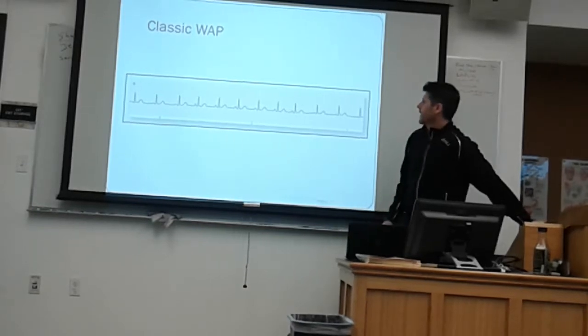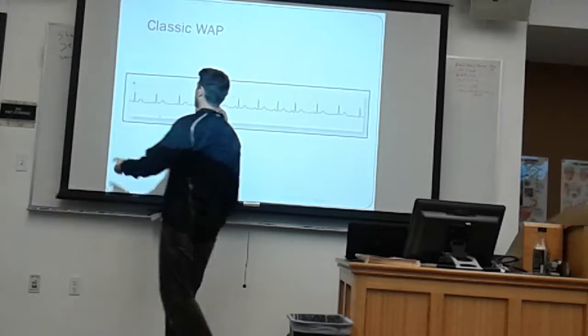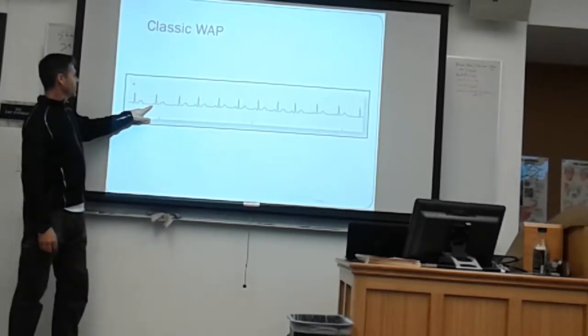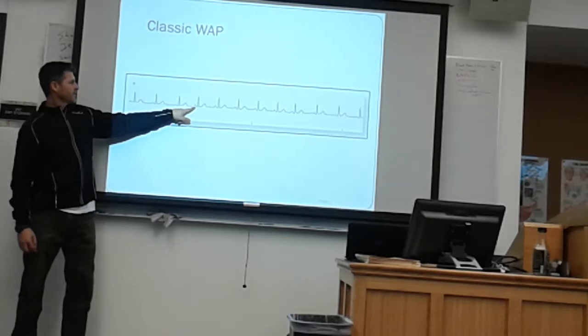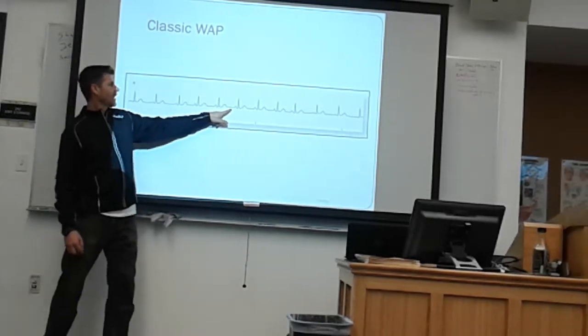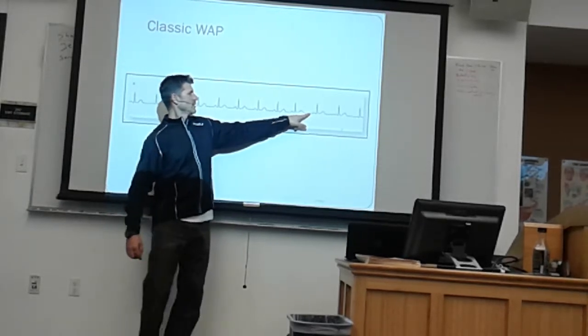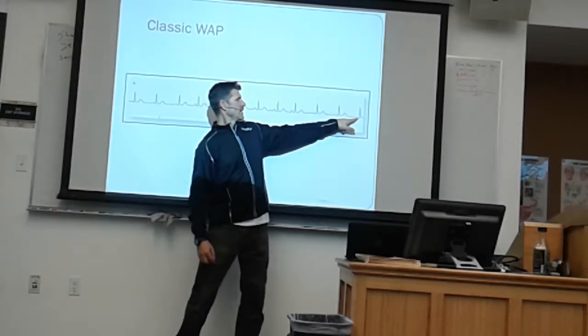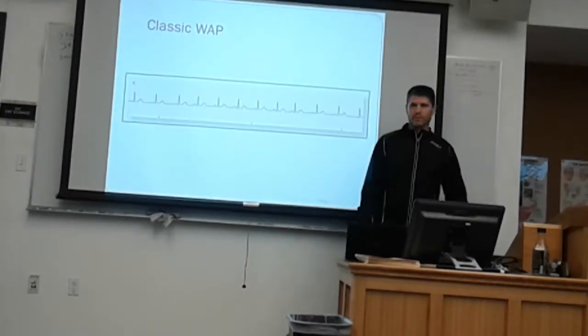So here, this classic looking wandering atrial pacemaker starts with some level of P wave, and you see a difference in those P waves. We see some commonality, but then it starts to go back down. We're losing the amplitude. Now it's completely lost. So it goes through a transitional phase with that.